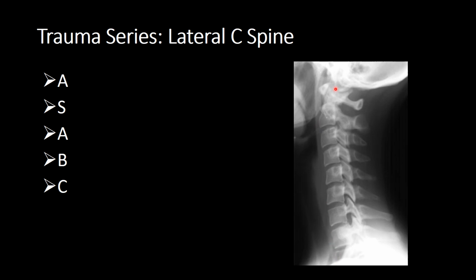We run down the posterior cortex of the vertebral bodies. This is normal. We run down our spinal lamina line. Now remember, there may be a small offset for C3, which isn't present in this case, and that's normal. This particular patient has a normal spinal lamina line. The spinal lamina line is not sensitive to rotation, so this is particularly helpful when assessing C1, C2.